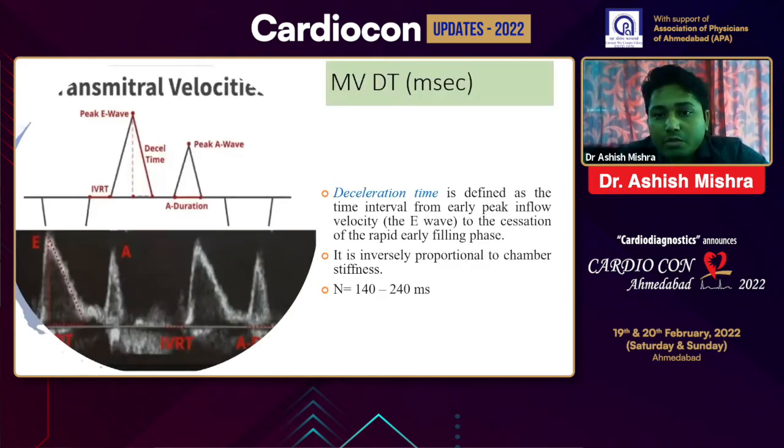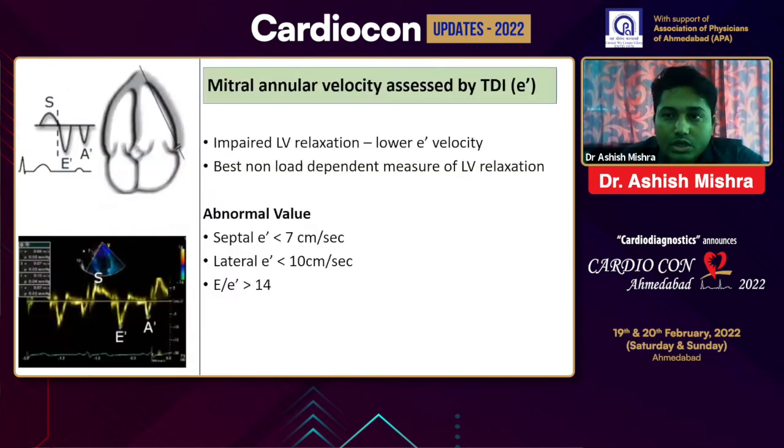Another variable which should be looked at is the deceleration time, which is defined as the time interval from the early peak inflow velocity of the E wave to the cessation of the rapid early filling phase. So this is the typical deceleration time from the peak of E wave to the baseline. Normal limits are between 140 and 240 milliseconds, and it is inversely proportional to chamber stiffness.